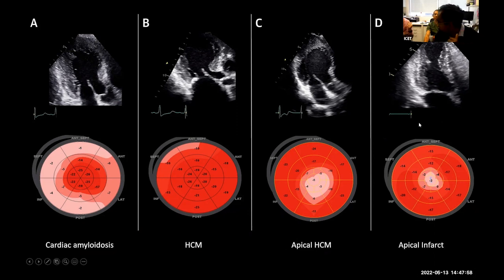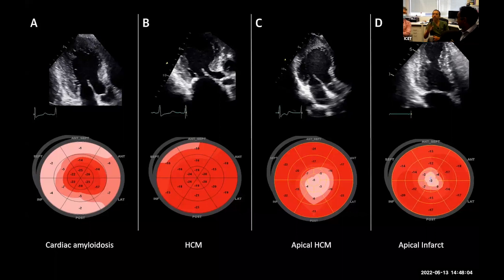Okay. Can I just pick on Ben just a little bit? He says aneurysmal, right? What's the definition of aneurysmal? So aneurysmal would mean that during systole there is contradictory, outgoing motion of that region of tissue. So if there's outgoing motion, do the speckles come together or do they go apart? They'd go further apart. Right, so you have a positive number.